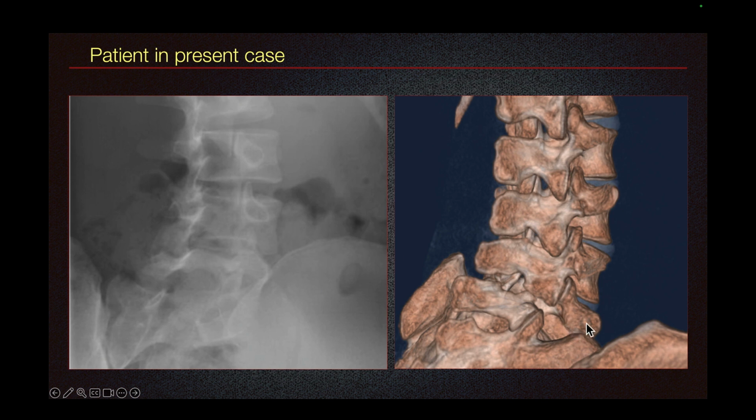Let's look at the level of the fracture. Nose of the dog, the transverse process. Superior articular process, the ear of the dog. And we don't see the neck. There's a big defect in the neck. So this is our pars fracture. Let's look at the radiograph. This is the nose, superior articular process, and this is the neck. And we see the fracture of the neck. So this is a pars fracture.